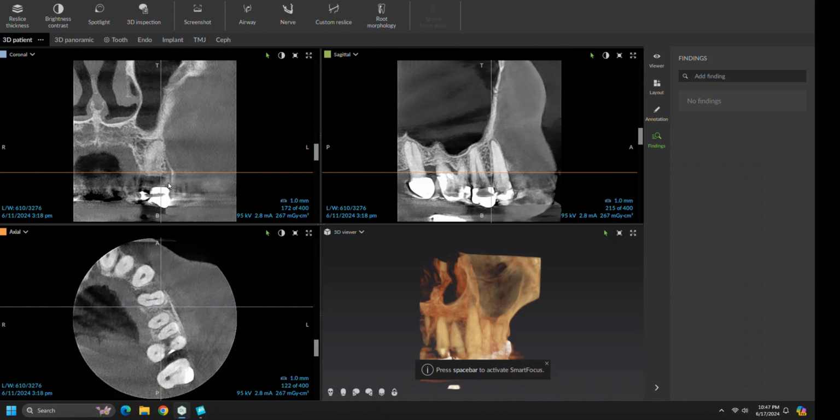I think the lesson here is just the occlusion. So the occlusion likely led to this tooth's demise. Whatever we build in this spot, or even if we do nothing, we have to understand that the occlusion was not balanced. Therefore, a tooth paid the price of that imbalance. Do we want to present to the patient equilibrating him or her to get them out of this pickle?